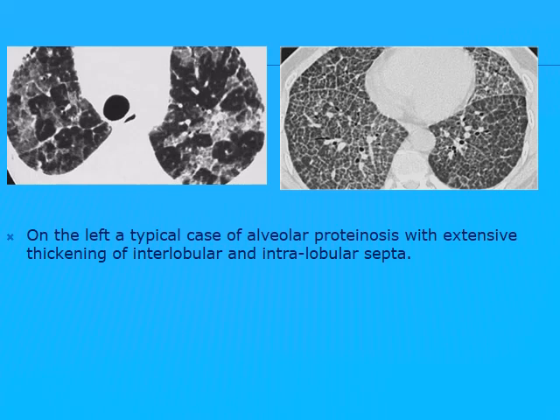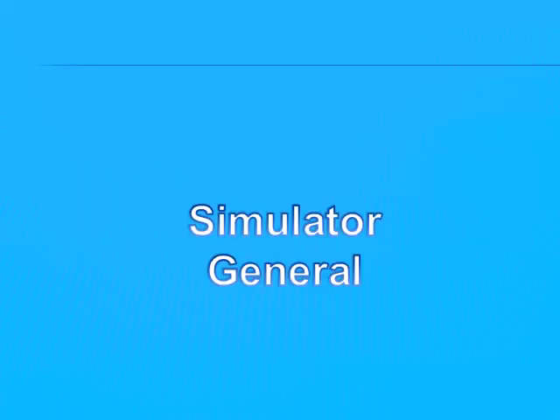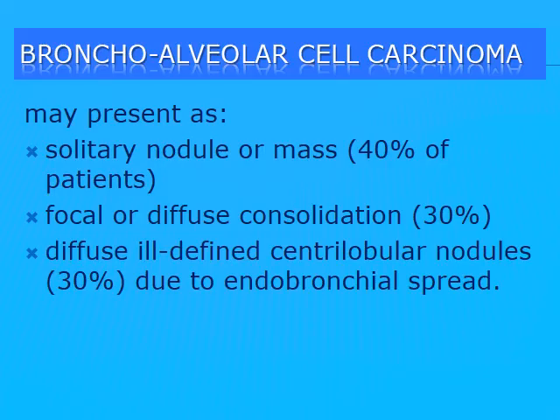It ranges from diffuse, like this, or multifocal, like this, with areas of air trapping around. Clinical correlation here is very important in alveolar proteinosis. You remember what are the great mimickers in these presentations? First one is sarcoidosis. Second one is cryptogenic organizing pneumonia. The third one, bronchoalveolar carcinoma, and now its name has changed to adenocarcinoma, low grade or carcinoma in situ.